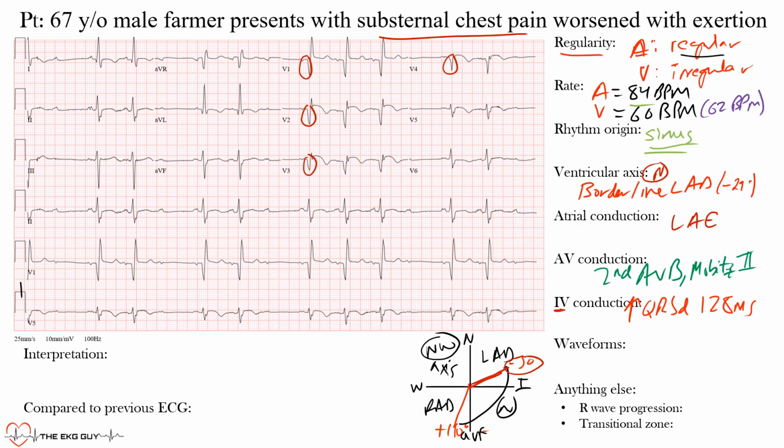In addition, you may notice that there is ST elevation. So here's our baseline. You can see some ST elevation also in these leads, maybe even slightly there, and flattening of them. Those are ischemic signs. And because you have Q waves associated with ST elevation, this is most likely an acute infarct. So that's one thing to keep in mind. It's involving leads V1, V2, V3, and V4, which are the anteroseptal leads. Notice in V5 you start to still see that R wave, so that's still expected and maybe not involving that region of the heart.